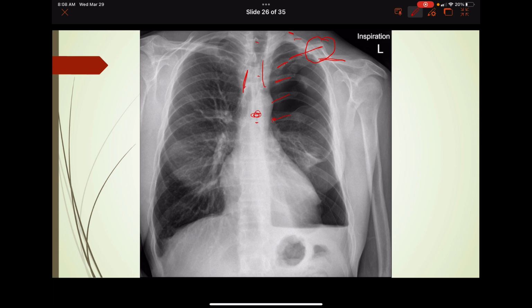Cardiac silhouette. Diaphragms, you can see this diaphragm, you can't see, has a pleural effusion, gastric bubble. You can see that layer of fluid there. It's probably blood. Again, I don't have any history on this particular one, but he definitely has a fractured clavicle up there, and may have a fractured rib back there as well. If that happened, that's a lot of force to break that rib up there.